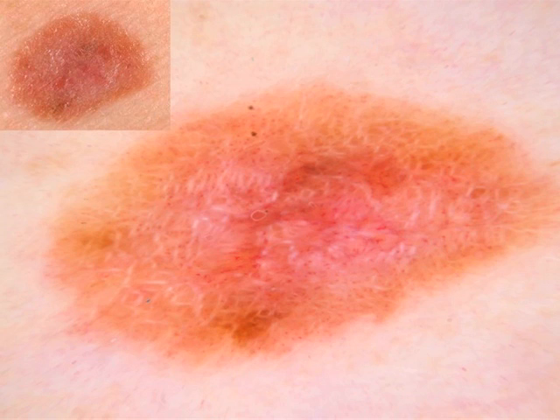So here is a lesion. Notice the dotted vessels throughout. It also has the crystalline structures. This is a lesion that actually the pathologist, a group of pathologists, could not tell us exactly what it is. Spitz versus melanoma, yeah? There was no way to know exactly what this was on the histology level. Another melanoma, dotted vessels.